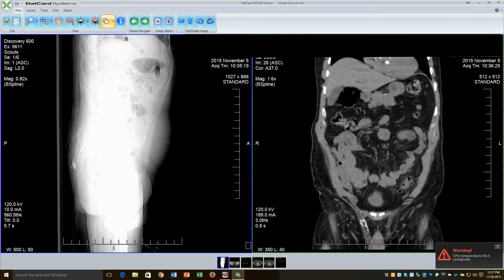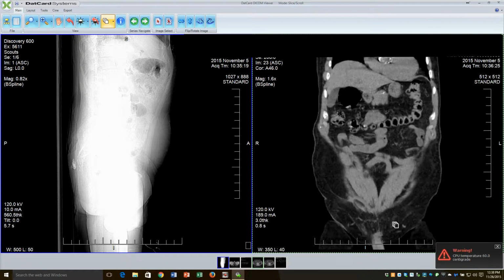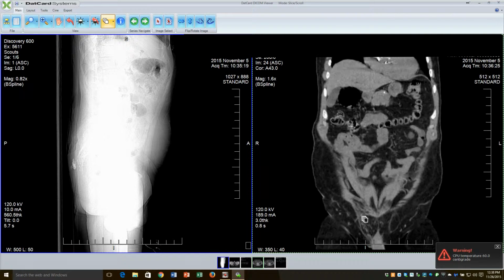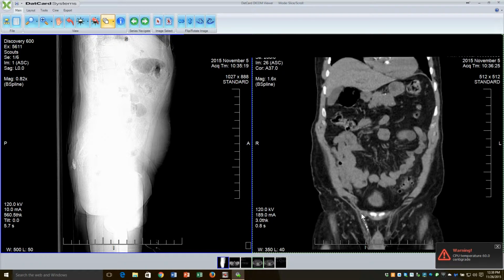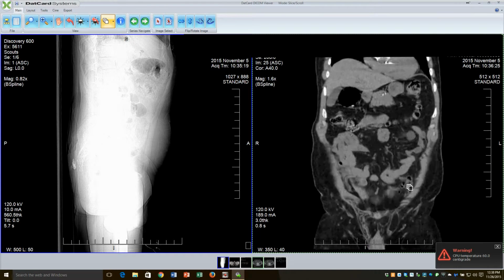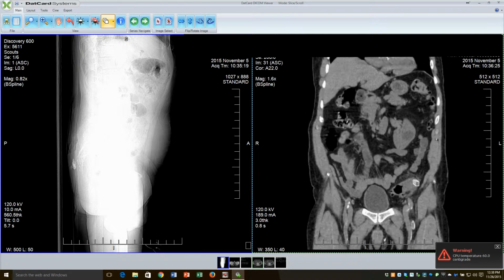So I would watch both of those. Neither one of them have intestine in it, so they don't need any action now. The one on the right seems to have a little more definition to it, but it's not a full-blown hernia yet, and neither is the one on the left in the inguinal regions. But the real finding here is acute sigmoid diverticulitis.